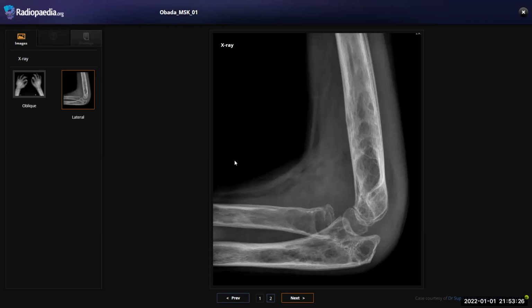It can be diffuse intramedullary metastasis, which can also appear similar, metastasis from thyroid or renal. In an immune compromised patient like this, do you think infection is a possibility? It can be. Infections, osteomyelitis can also occur in such patients.